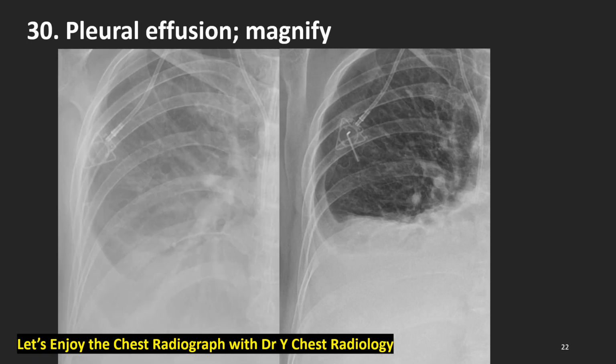Let's confirm once again with this magnified view. This is the most important slide of this session. Pleural effusion in AP supine film. Yes, the right lower lobe is passive atelectasis. Yes, let's disregard this one too.